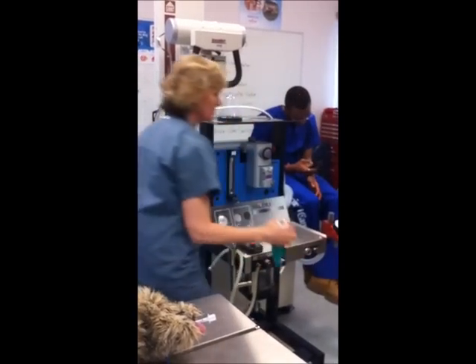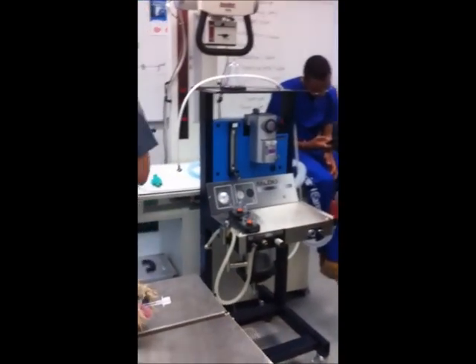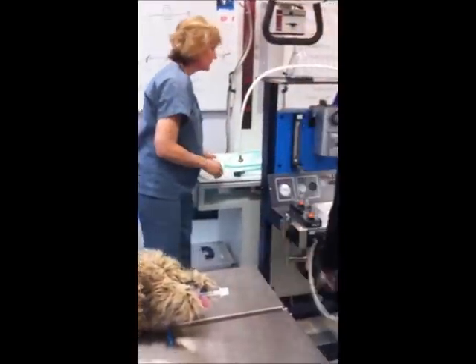I'm just gonna get a picture of it. Okay, so go ahead, hook it up, do what you gotta do.